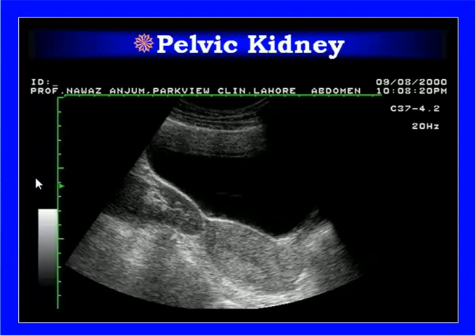showing the appearance of a horseshoe structure. Here you can see in this picture the uterus, the urinary bladder, which is darker, and on the left is the right pelvic kidney.